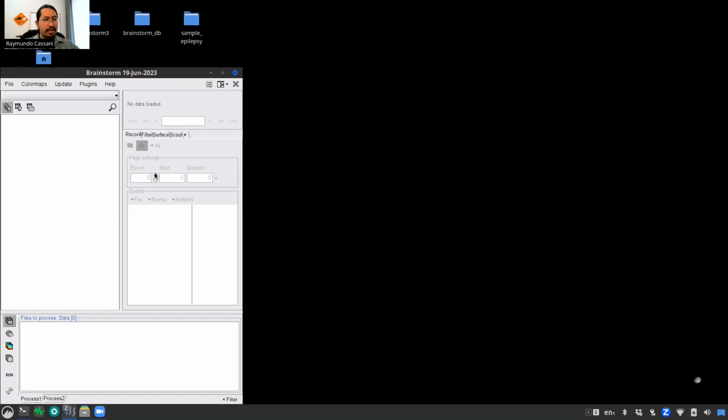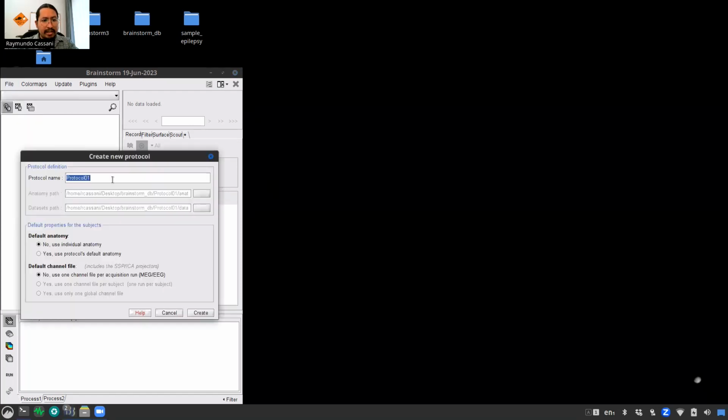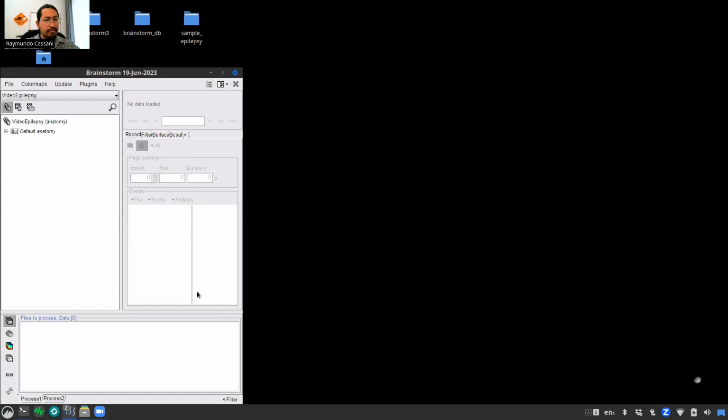First, we need to create a new protocol. So we go to File, New Protocol, and we give it a name. We select default anatomy no, and default channel file no, as we have the anatomy and the channel positions for the subject. We create the protocol.